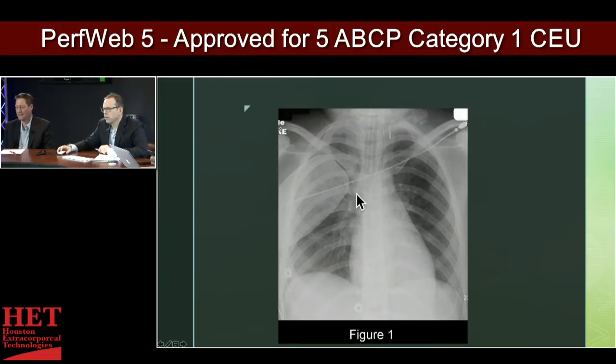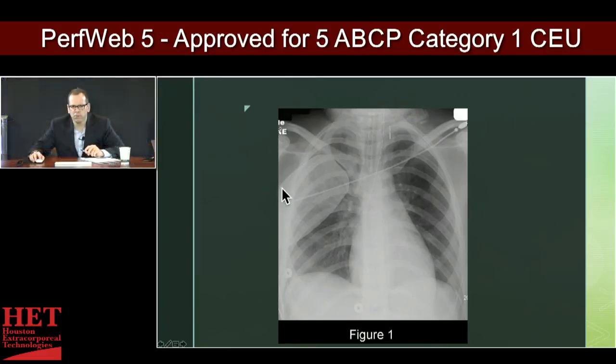It could be a little bit wider, to see all the way out to the end of the chest wall on either side, but this is a good film. You can see that yes, the bone structures are in fact normal. This pericardium could be a little bit enlarged. It also seems a little bit elongated. So this is probably a tall, thin person as well. The diaphragms are not flattened.